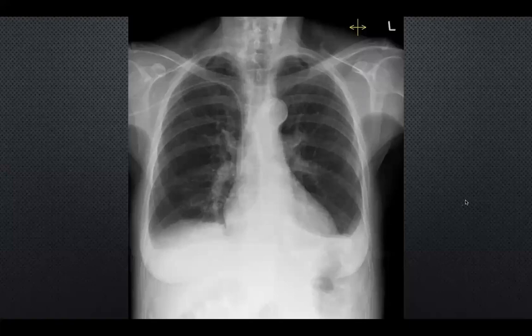Does somebody want to present this one? Again, just describe what you see, really. Yeah, go for it.